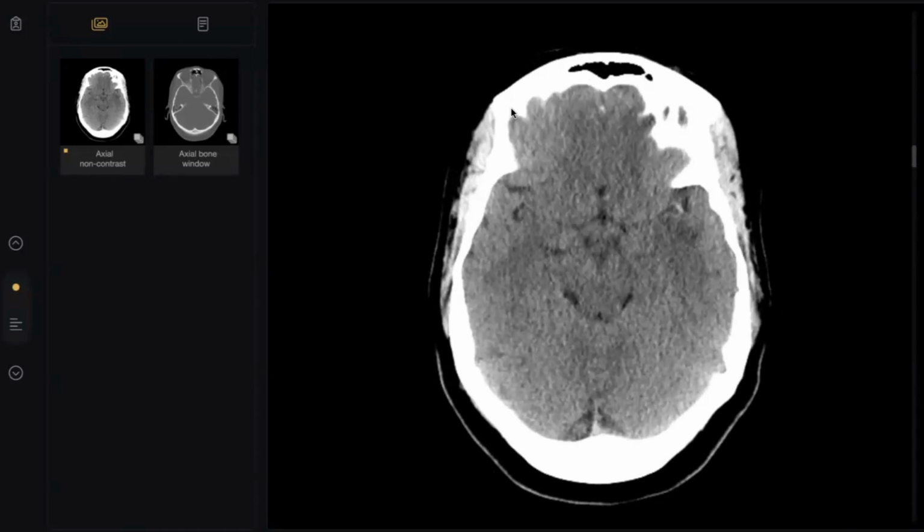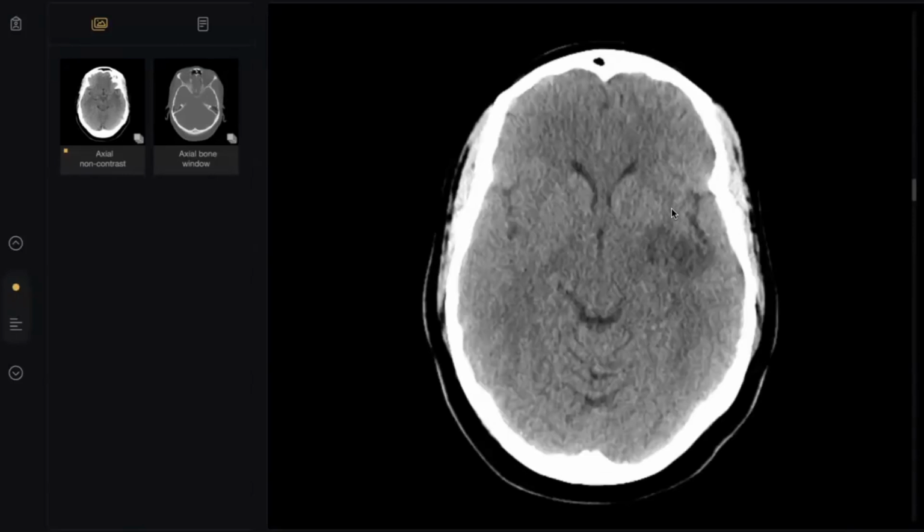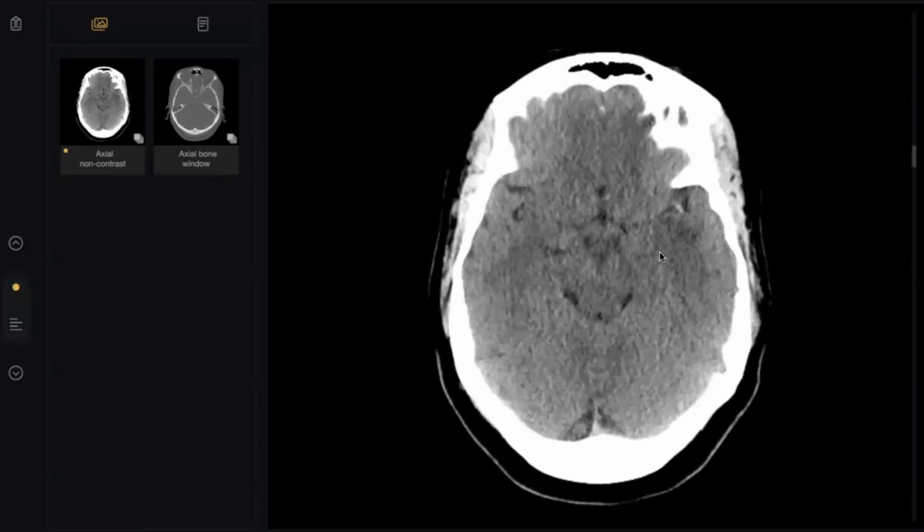It could be cerebritis, infection, or an underlying neoplastic lesion, but that is a remote differential diagnosis. I'm not happy. You described very well. What is the middle cerebral artery dense sign? Infarction. So why are you talking about cerebritis? Go on, so your diagnosis? Left middle cerebral artery acute infarct.